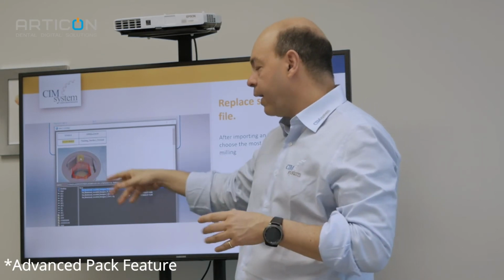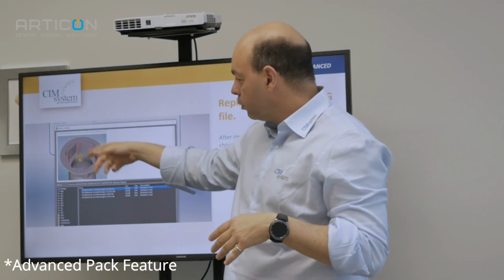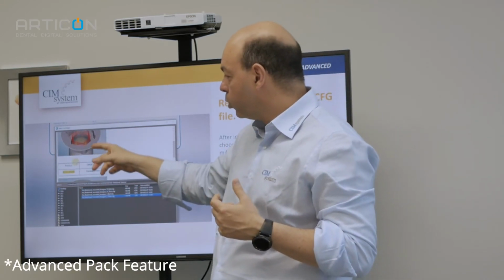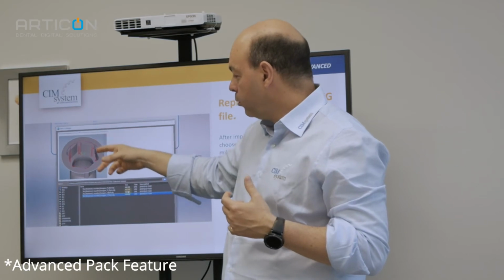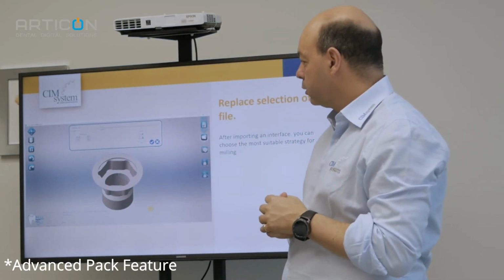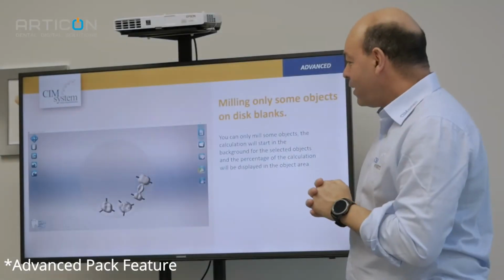Okay, I have one list of the strategy. You select here. Oh, your settings are already... Yes, it's all set already. Here is a small image for explanation. Okay, and when I import now, after milling he applies this strategy.